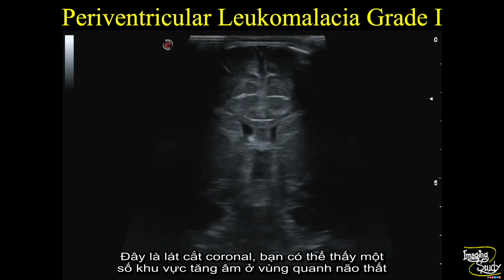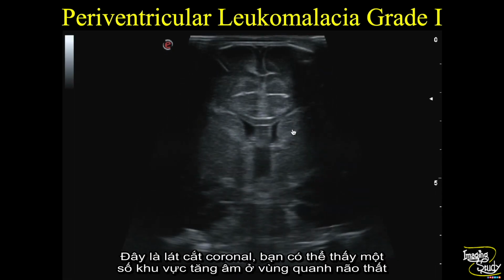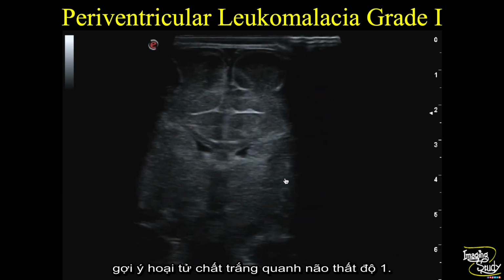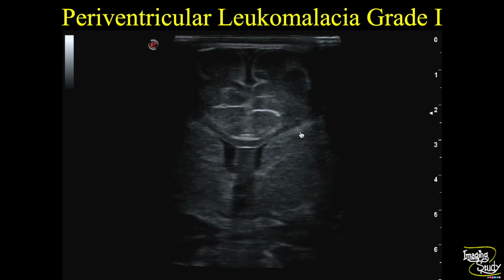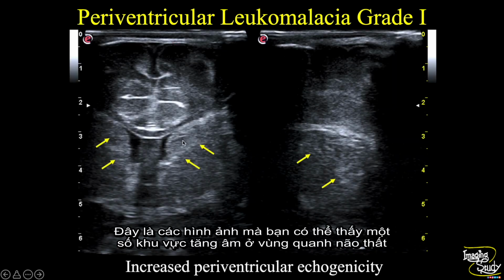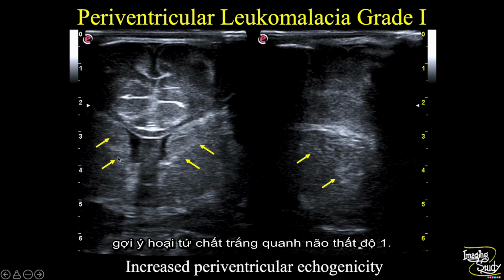So here's the coronal section. You can see some echogenic areas at the periventricular region indicating grade 1 periventricular leukomalacia. Here's the picture. You can see some echogenic areas at the periventricular region indicating the periventricular leukomalacia.